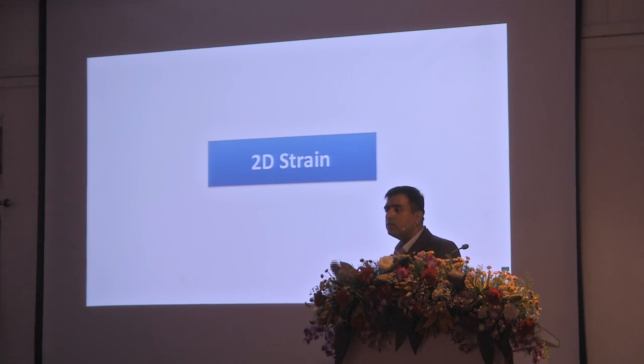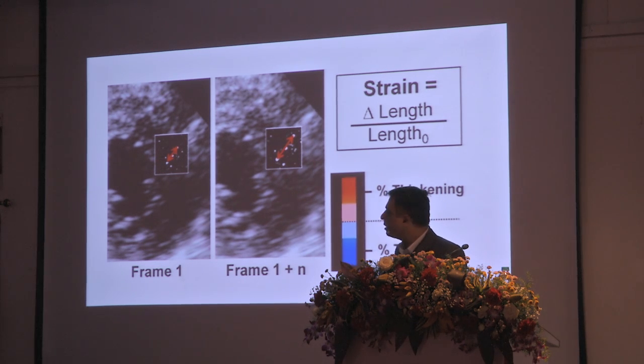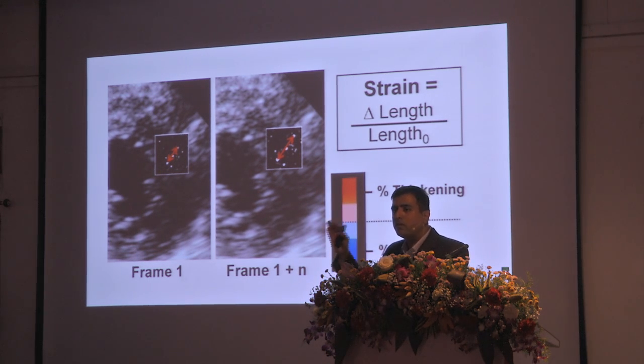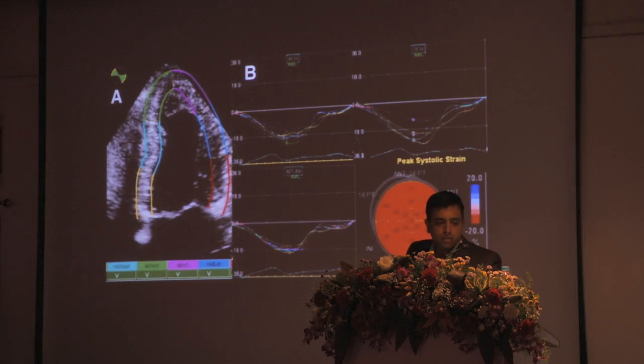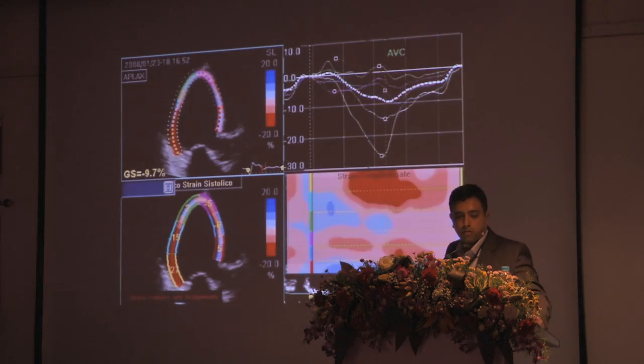So to overcome all of this, and this is a modality that you and I will be using in the future, you have speckle tracking or strain. There is no Doppler involved in it. Okay. There is a good 2D image, and what they do is these white speckles, as they are called, the computer marks these speckles and sees where the speckle has moved from one frame to another. And hence, it knows the displacement or how much the speckle has moved, and it can calculate strain directly without any Doppler, without time, velocity, nothing. So the future of tissue imaging will be speckle-based imaging, and you will get an automatic strain and strain curve like this, like some of the machines that we will show you here.